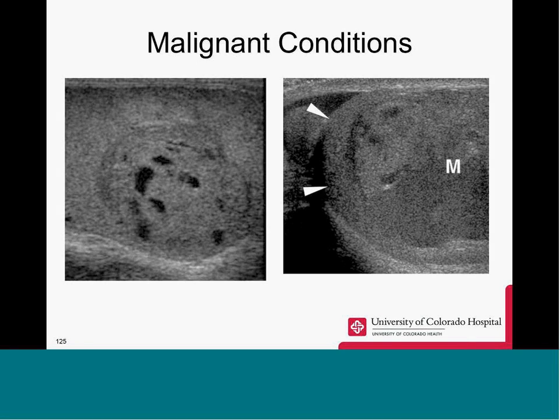The sonographic appearance of non-seminomatous germ cell tumors reflects the histological features. They are typically more heterogeneous than a seminoma and have both solid and cystic components. Coarse calcifications are common. It is not possible to distinguish the various subtypes of the non-seminomatous germ cell tumors on sonography. Here you can see on ultrasound this heterogeneous mass within the testicle. This left one showing a rim of normal testicular tissue with this more heterogeneous mass.